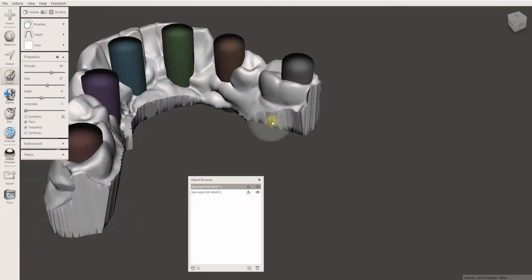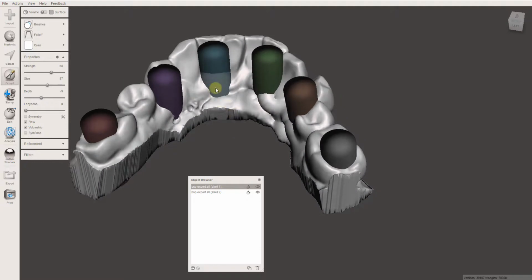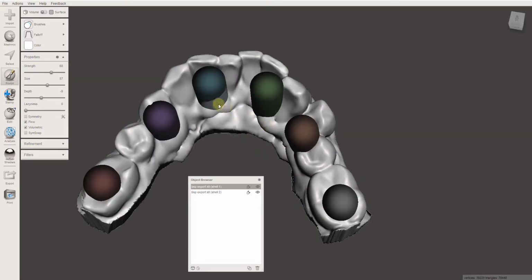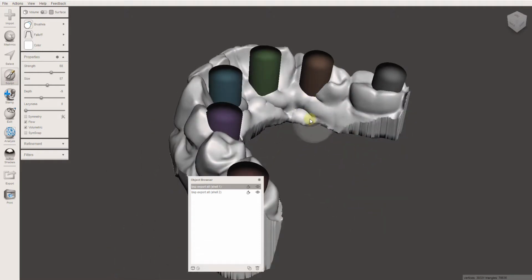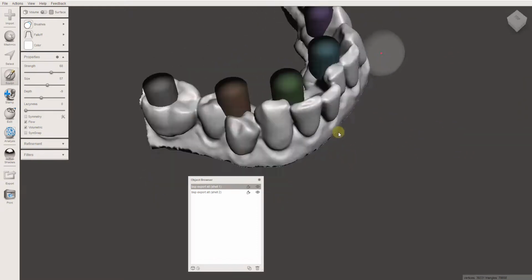So that's an easy way to bulk things up a little, and I'm going to do it for some of these other implants too. And it makes these little creases and cracks, and that's not a big deal. It's easy to smooth later. And this is just kind of adding some tissue because it's easiest to add tissue here, and then in a minute we're going to go back and smooth that off. We can probably do that now.